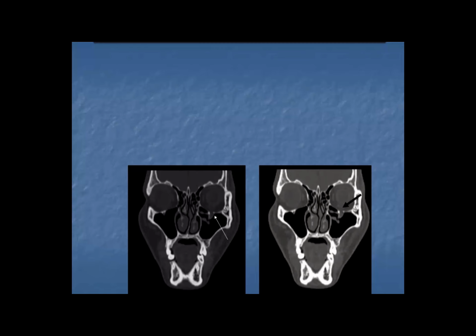That causes a sudden increase in intraorbital pressure, leading to fracture of the inferior orbital floor into the maxillary sinus or the medial wall of the orbit. Sometimes the inferior rectus muscle can be trapped in the fracture, leading to restriction of upward gaze and diplopia. Here is the fracture of the orbit, and the fat is trapped into the sinus.